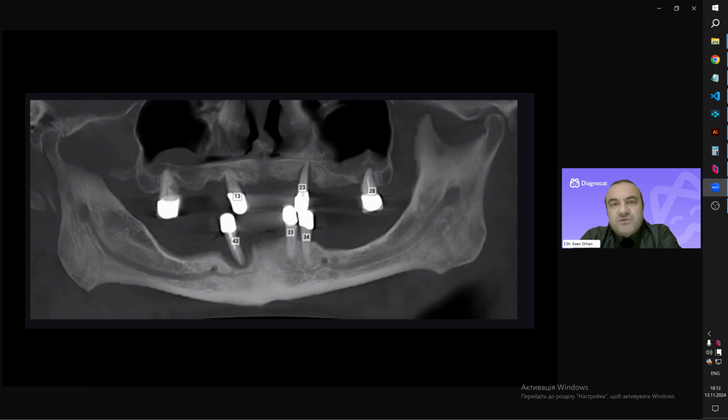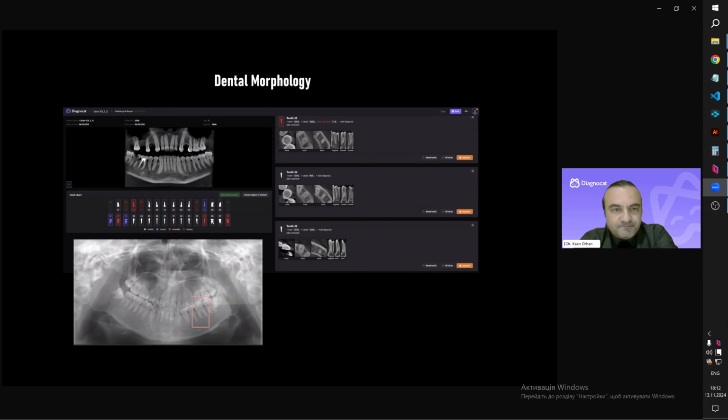This is quite important because in 3D imaging, as a radiologist, if you give me a volume, I have to do it by myself using a couple of programs and drawing the curve and so on to achieve the OPG. But right now, we don't need to do anything at all. The DiagnoCAT is just doing it for you, and the AI modeling is making the best curve and producing the OPG and the tooth numbering instantly from the 3D volume.